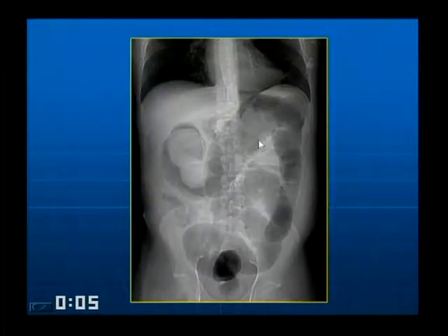I'm sorry I did not bring the virtual colon. This was actually an attempted insufflation done for virtual colonoscopy. And this distended colon is therefore manual insufflation. See if we can outline this intussuscepting mass, very large mass, smooth. So what do you think is causing it?